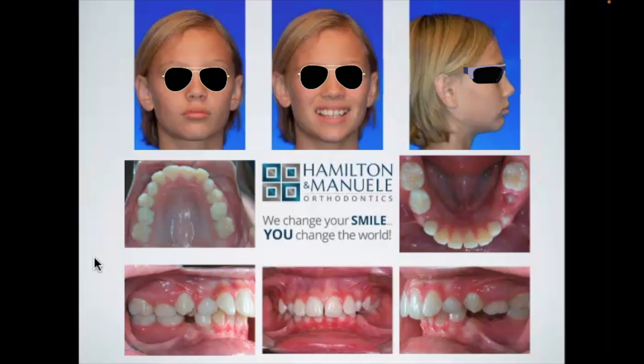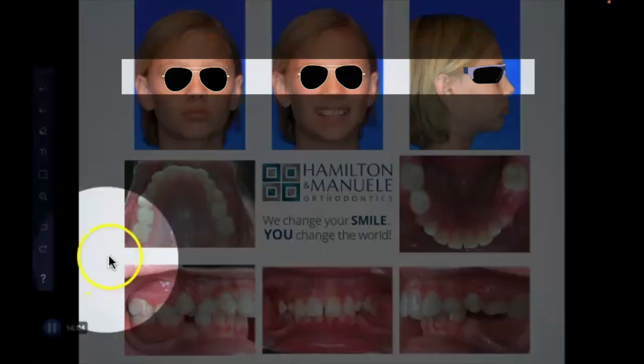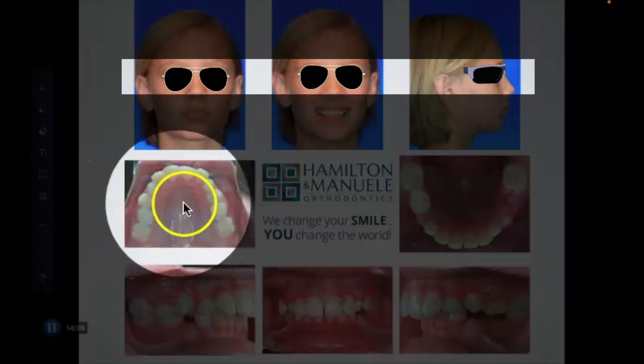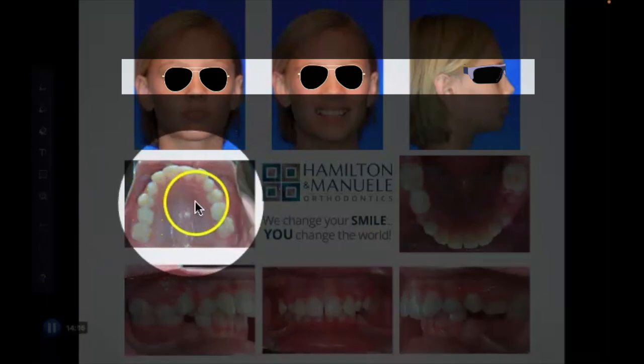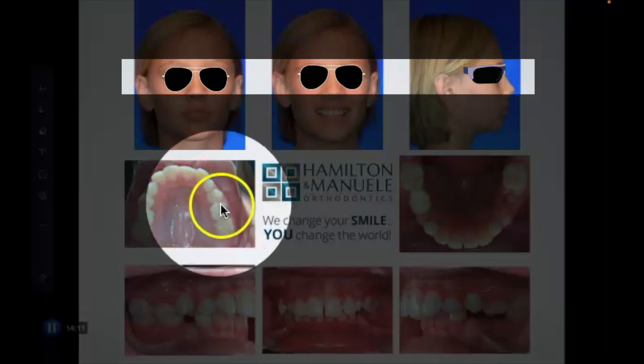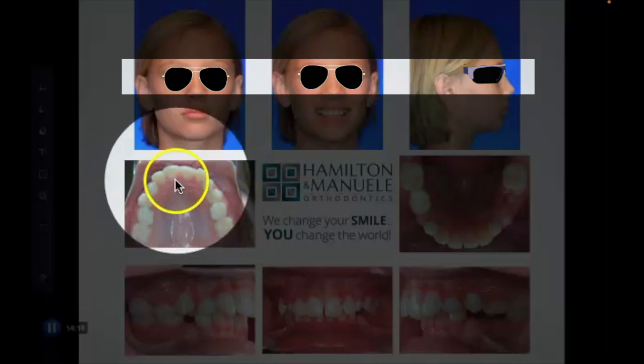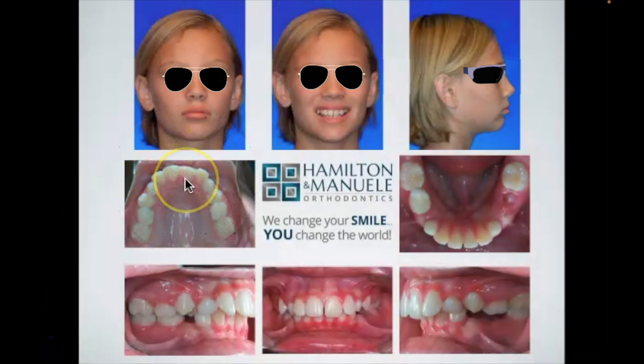So that helps you to very quickly separate out and figure out how much room you have for the teeth that are in the arch here. Now when you look here, you can see this is actually first premolars, and those have enough room. They're about the same as the primary first molar, so that's kind of a wash. These are smaller than the permanent canine. These are bigger. She has all the teeth. We should be fine from canine back. So now all we have to focus on is the incisors.